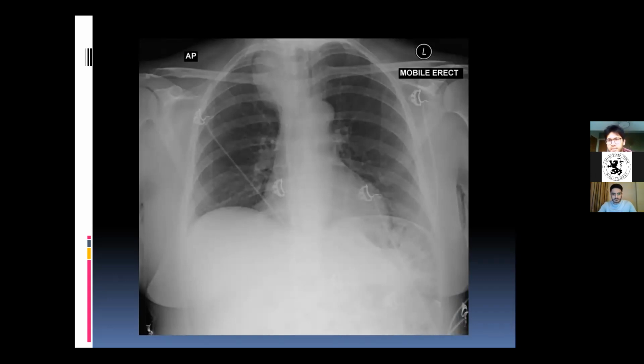Trick question, there is a deviation. So there is a clear deviation. I'm going to try and get the laser out. So there is a deviation right here.